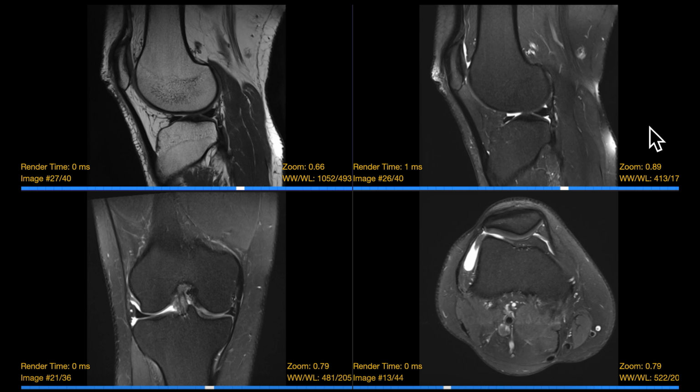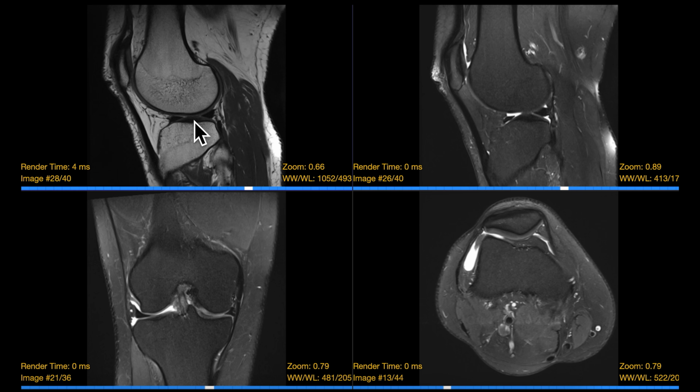So when you're looking for bone pathology, you might see a contusion, which will result in loss of the normal bone marrow signal and sometimes alteration of the contour. So if you think about the proton density fat-suppressed images here, for example, you might see bright signal and you might see some deepening of the cortex if you had a contusion. On the other hand, fractures will show similar loss of normal bone marrow signal, but you'll also be looking for a disruption in the cortex or linearity in that area of the bone contusion, and we'll show you some examples of that.